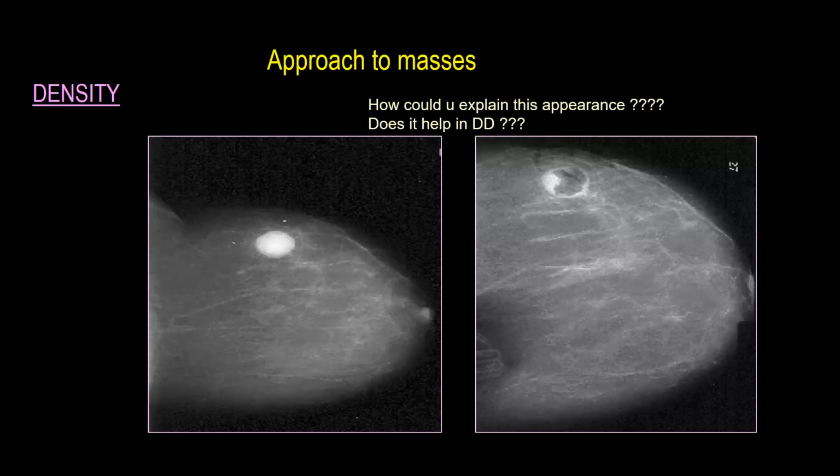Hematoma. If it is a hematoma, it has to get enlarged. It is more or less the same size as that mass. What do you suggest? Hint: you said aspiration. What happens if they aspirate?